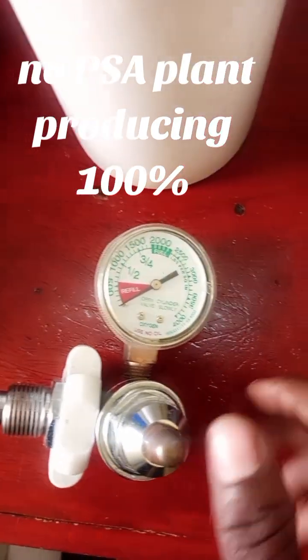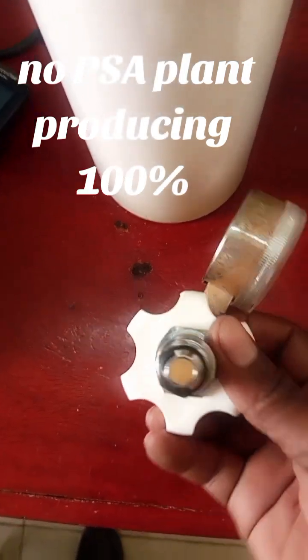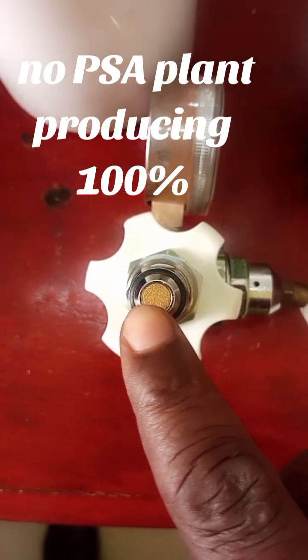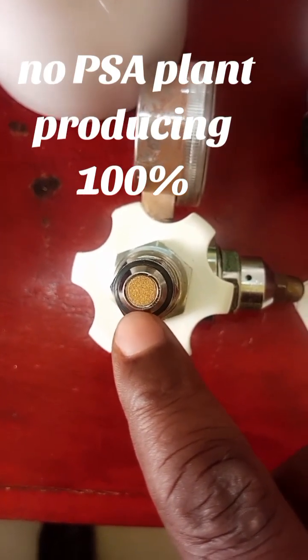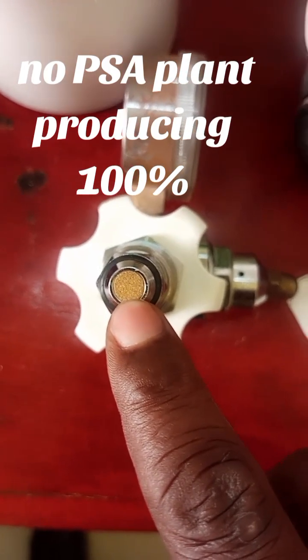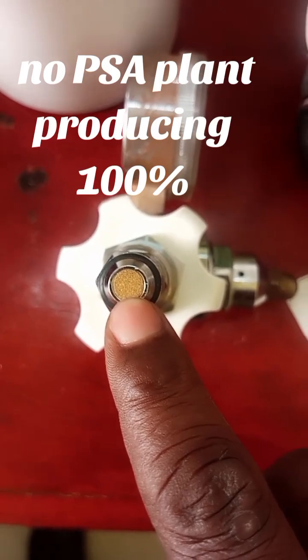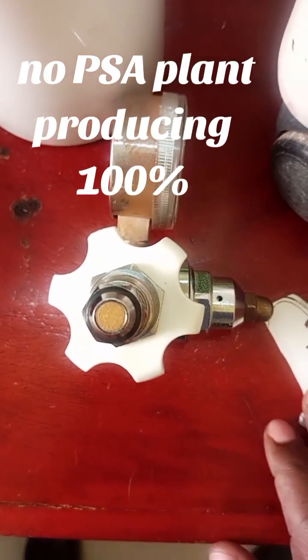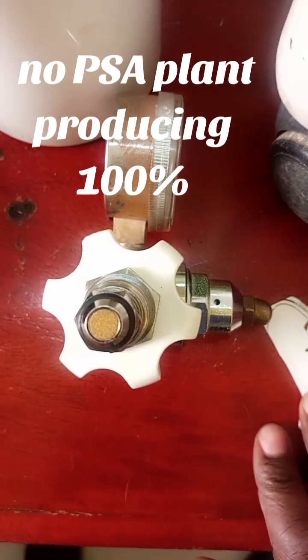Apart from that, we have this. This is a filter. In any working circumstance, the filter may become very dirty and may block the passage of air to the patient, so you need to change it.